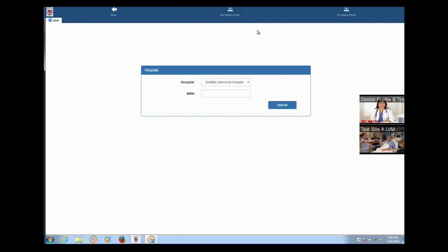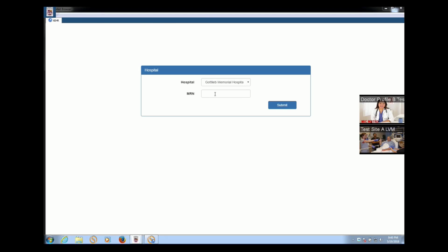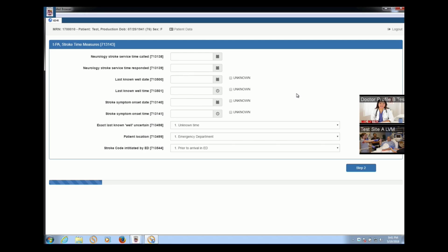as they want. With a few quick clicks, a web form is opened, allowing them to enter the patient MRN and submit that as a query to, in this case, Epic, going over the RedoxEngine gateway. Redox sends an HL7 query to Epic. Epic returns information, which is displayed in the web form.